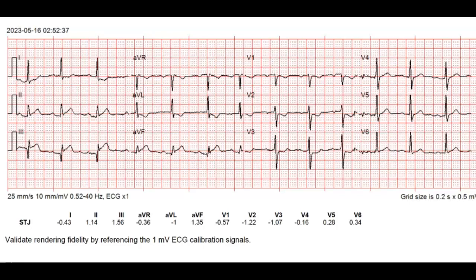All right, EKG interpretation. This EKG is from M417, May 16th, 2023. All right, so estimation of rate. Ooh, I can't help myself but use the medium box method. It's not always that common that you have QRS complexes fall right on the line for you.